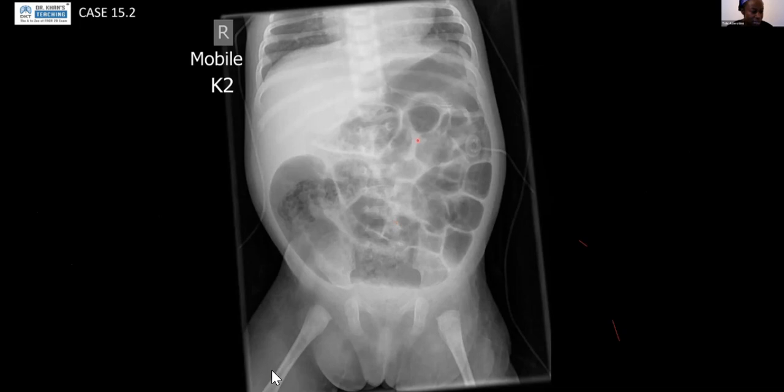Moving on to the next case. Here we can see the mottled lucencies suggestive of NEC, and there is no portal venous gas, you're correct, and there's lots of dilated loops. But up here, you've got this weird lucency that's triangular in the upper abdomen. And this is where your pneumoperitoneum is. The bowel does not make triangles. So if you see triangles of air in an abdominal radiograph, it's pneumoperitoneum until proven otherwise.